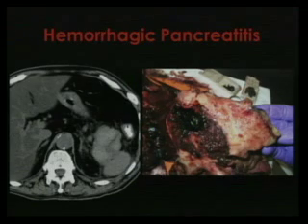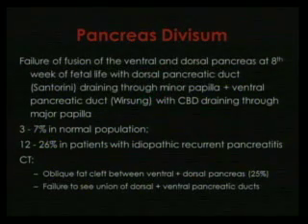What I say is, did we have any clue or any tip to say this is probably not a malignancy? Well, the density. If we see the density, it's unlikely to have a tumor with that density in the pre-contrast phase. This amount of hemorrhage is probably from the hemorrhagic pancreatitis. Keep in mind these findings for the future. Pancreas divisum is a failure of fusion between the ventral and dorsal pancreas, and sometimes can simulate a mass.